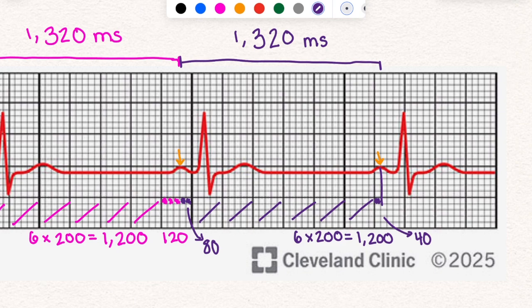Pretty much exactly the same as my previous heartbeat. Notice that I cannot do another round of this calculation because I have no more sequential P wave crests that I can see on the electrocardiogram. What that means is that I am ready to move to my next step.